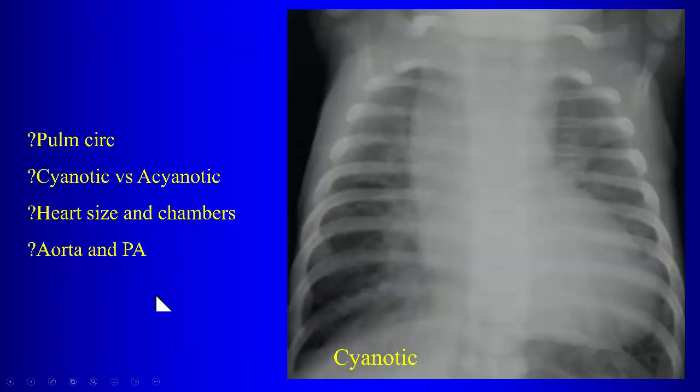Okay. All right. So here, pulmonary circulation increased. I'm telling you, the patient is cyanotic. You're in the category of admixture lesions. The three big ones there. Total anomalous pulmonary venous return. Looking at the plain film, what might you favor?